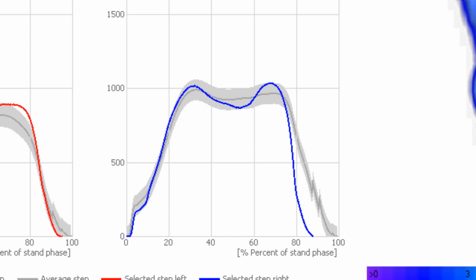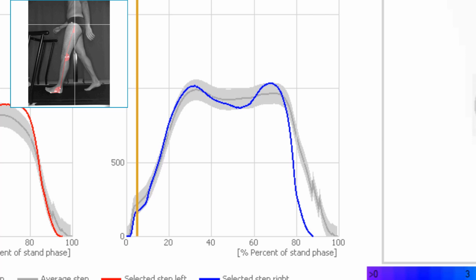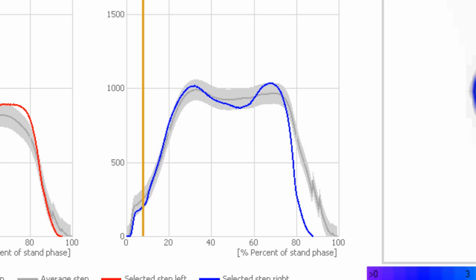The curve starts with a small peak, which represents the initial contact. Since the actual load transfer does not begin until after this point, the peak initially decreases again a little. This is due to the initiation of the physiological heel eversion and the soft heel cushion that initially transmits the force. From this brief moment, however, the force curve begins to rise in line with the load transfer. In the rising section, the body is in bipedal support.